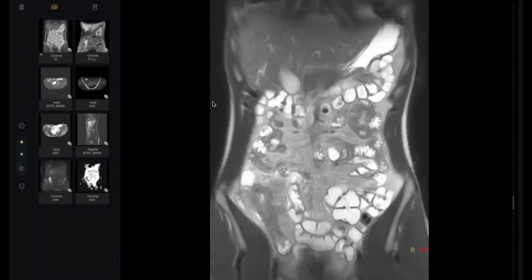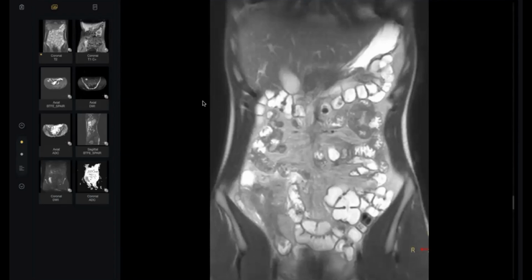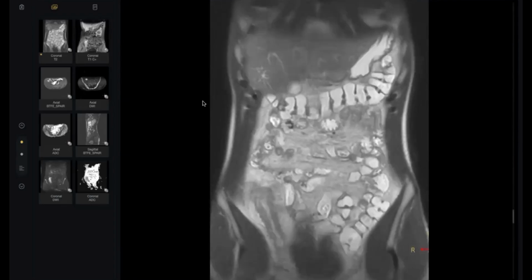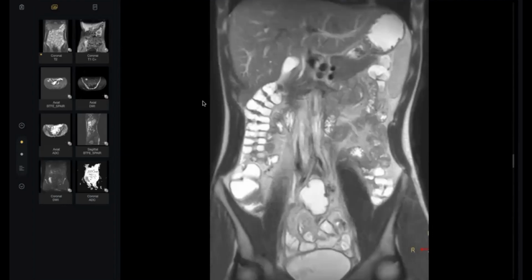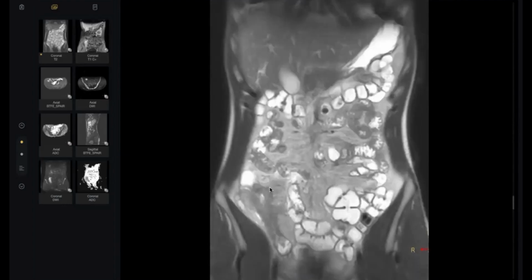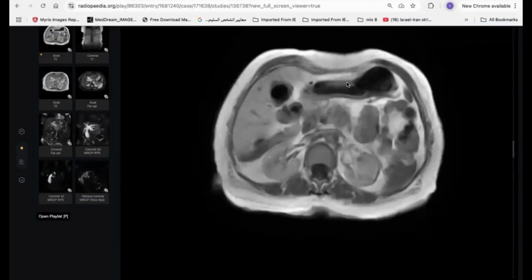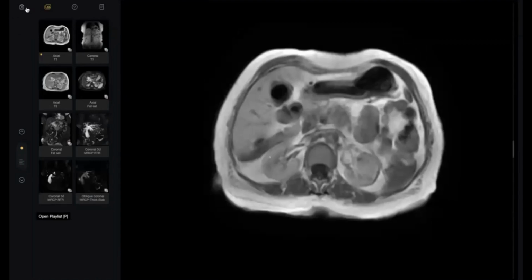So have a look and keep in mind this patient has recurrent abdominal pain, and this is MRE, so you will concentrate on the bowel, especially the small bowel. When you find this, start from here. Thank you, doctor, so much. Next candidate. Thank you, sir.